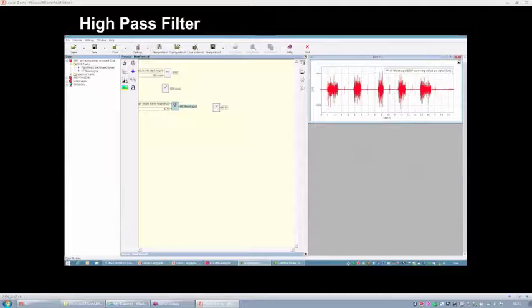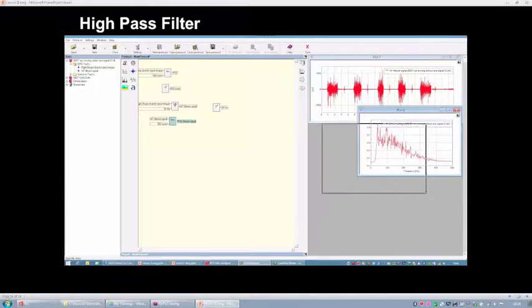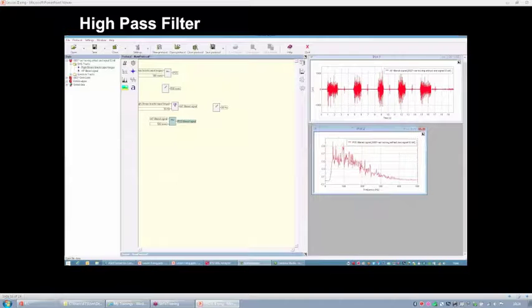And if you look again at the results coming from the spectrum of the filtered EMG signal, you can see that now we have recovered the contribution of the real EMG signal and we have completely removed the artifact. So this is a typical spectrum coming from a good EMG signal. Okay?